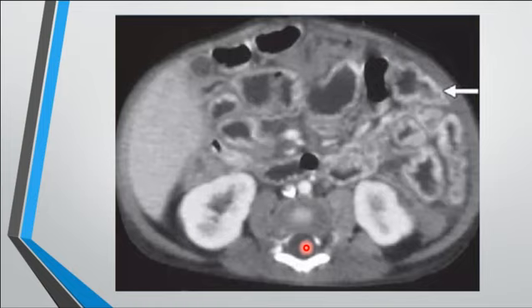Are there any signs of intestinal obstruction? It does not look dilated. There are no pathological air fluid levels, so there are no signs of intestinal obstruction. So, does anyone have any idea what's going on? No trauma here.